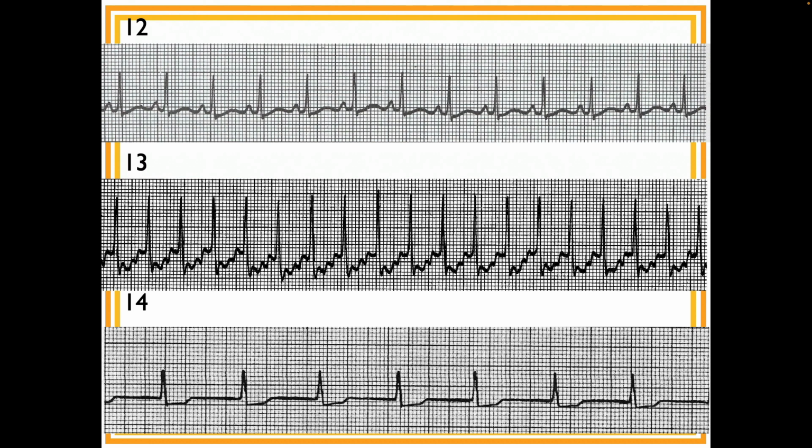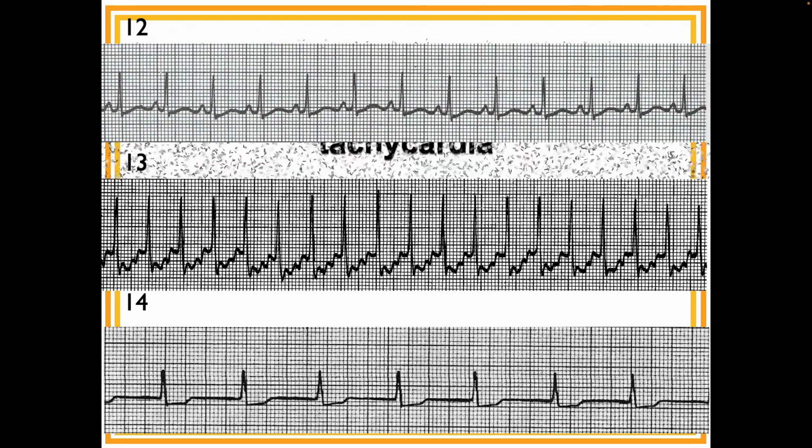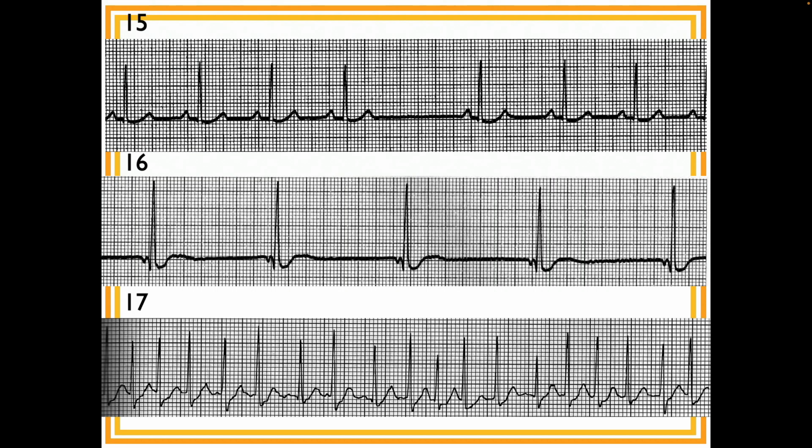Let me ask you something. I look at it and I think, wow, no P waves, narrow QRS. Are you sure this isn't atrial fibrillation? That's a solid question. With AFib, it's irregular. Oh, it's regular, so. There you go. So it is accelerated. I'm just messing with you. Okay, go ahead.